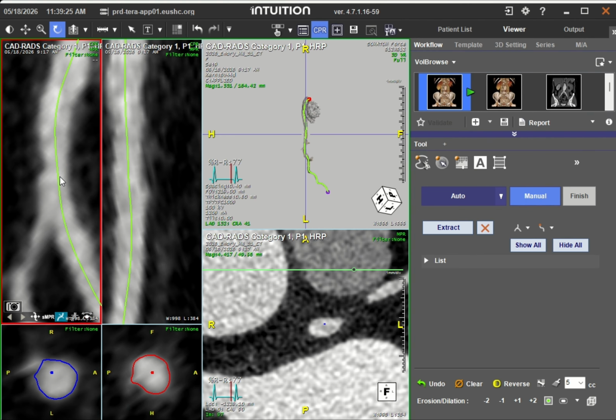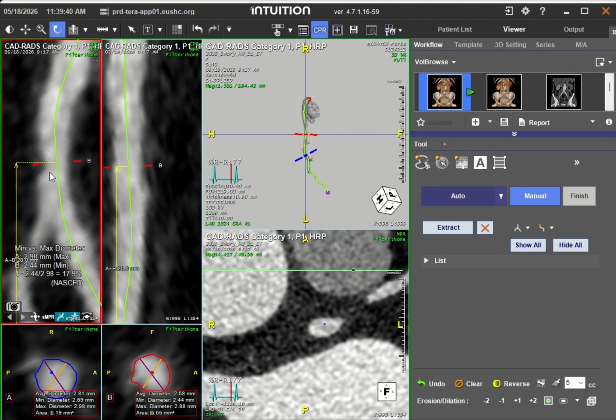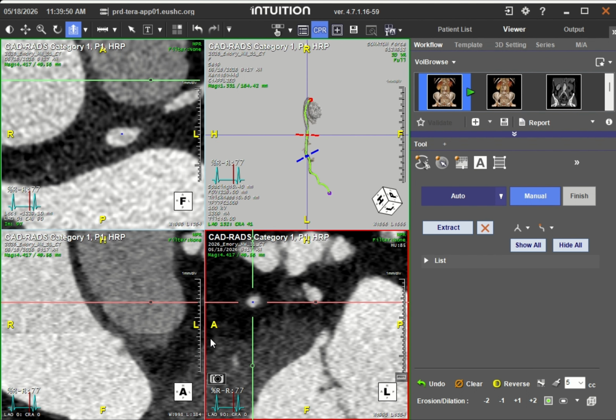And then click, oh, we need to turn that one on too. And then just click here. Where did our little crosshairs go? There we go. So here, this red plane represents this little field here.